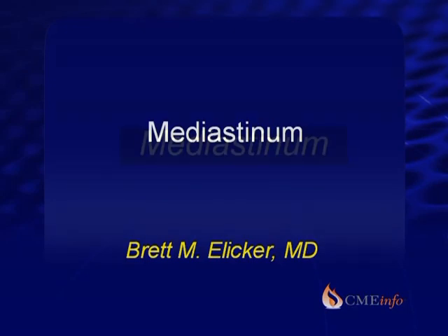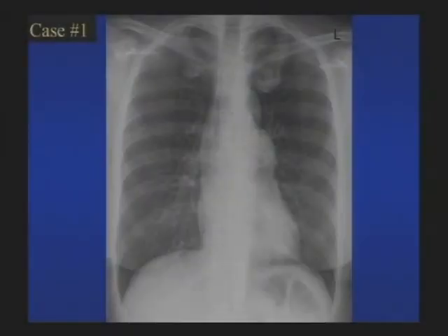We're going to start the afternoon with mediastinum and cases. And so, when we're talking about mediastinum, we're going to be talking about a lot of masses because localization and characterization of mediastinal masses is probably one of the big things we do. And on a plain film, you have to learn how to localize these things to a particular compartment of the mediastinum. And a lot of that involves the silhouette sign.